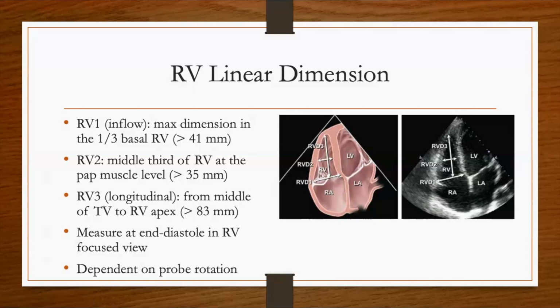So what happens when the basal RV is dilated, but by visual the RV doesn't look dilated? The RV basal diameter is one parameter used to assess RV dilation, but you have six or seven other views to see the RV. You don't have to stick mainly to the basal diameter.